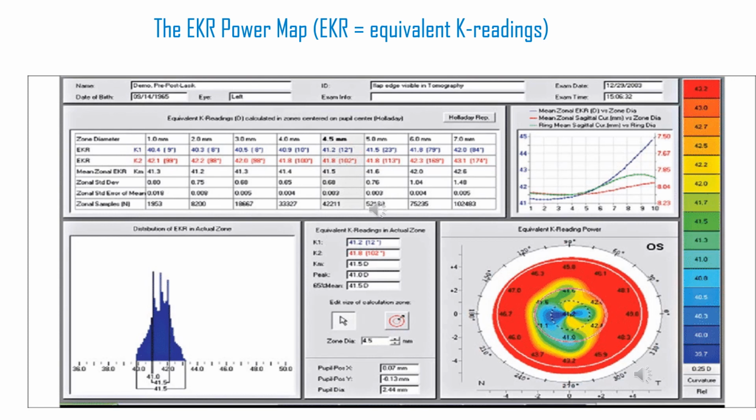The first step evaluates the anterior cornea and understands the posterior corneal values based on the true corneal indices, like the total corneal refractive power map that we discussed before. Once it has the corneal power map of both anterior and posterior with the true corneal indices, it converts it back into anterior corneal values with the historical corneal index of 1.3375.